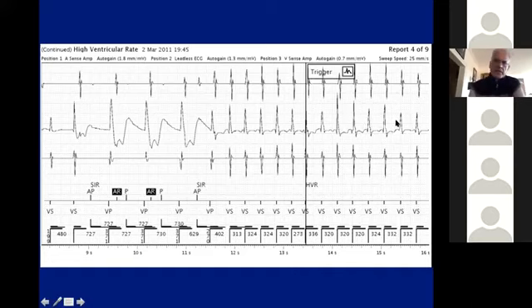So my interpretation of this is that this is actually A tachycardia, supraventricular tachycardia, conducting one-to-one. It's very regular, so it's very hard to tell what is driving what. But the sequence is such that it starts with a PAC basically, and not with a PVC. Any questions, any comments about this electrogram?